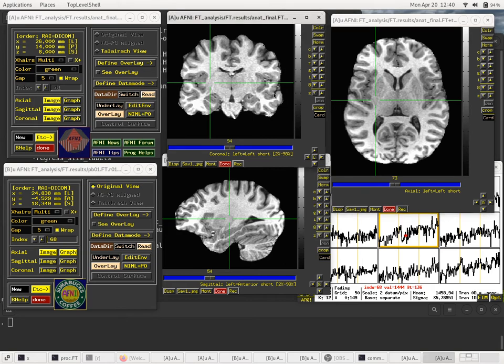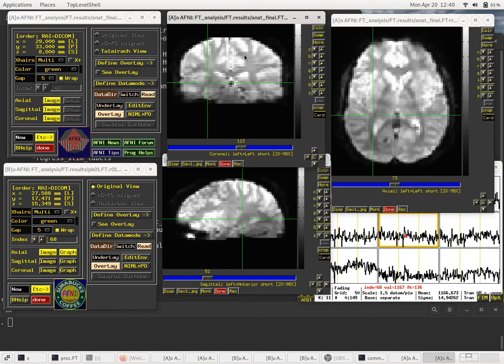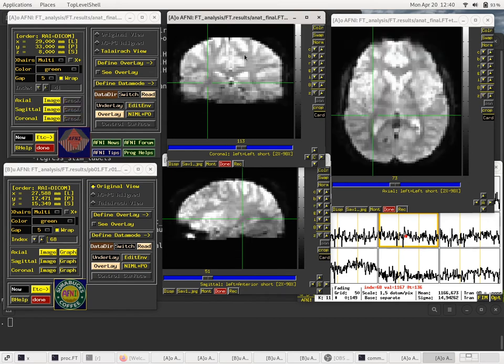These are a little bit too symmetric to make a nice point. I guess that should be obvious enough. The mid-sagittal areas are generally helpful. You see how these line up very nicely. But if there were a left-right flip issue, you'd be able to detect it with that.